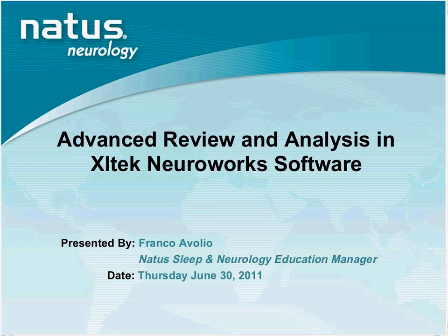There's a setting where you can have your computer restart a study automatically after a set time. I want to show you something in the channel labeler. It's just a resize option. I want to show you something in the report templates. I will show you how to compress video, talk about pruning a little bit, and export your data points from a study into an Excel file.